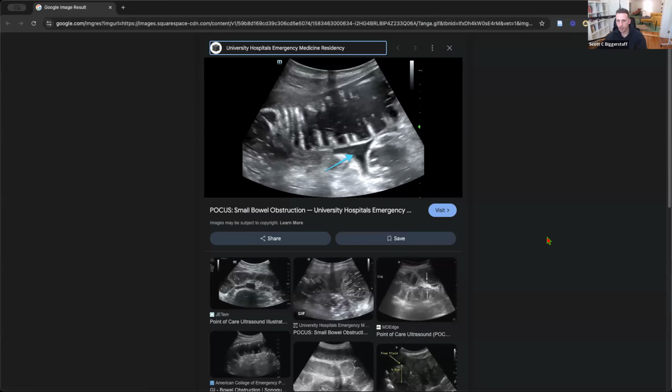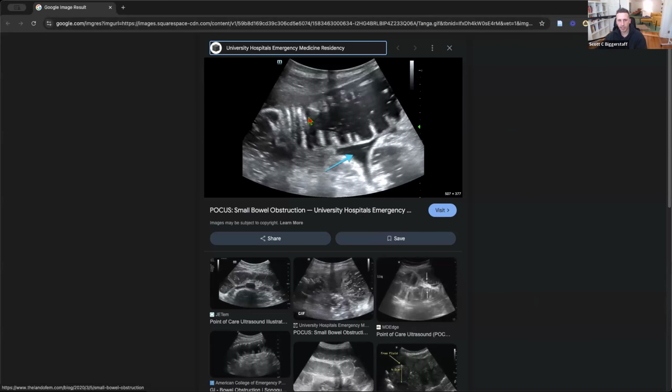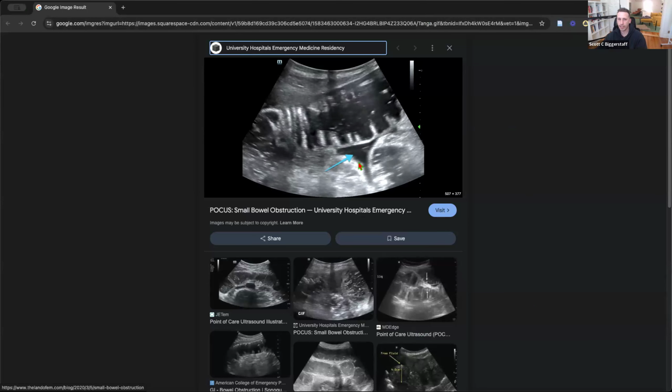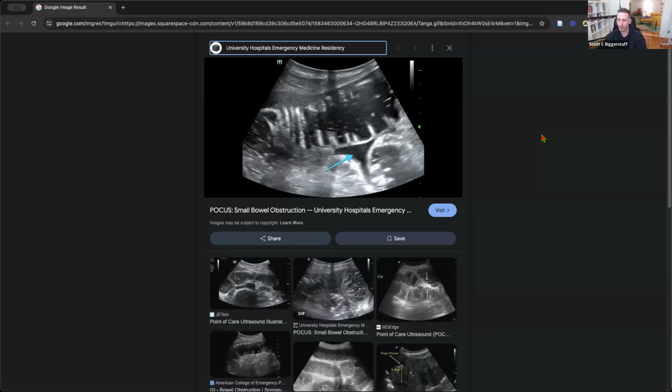Here's the image that Andrea shared in the chat. So you've got the plicae, like she was saying, these kind of fenestrations in the bowel, and then this is fluid that's collected in the abdomen between intestine. So you have that thong or bikini sign. Probably it's due for a more politically correct name at this point, but I'm not sure what that would be in the moment. Now that's all I can see. So I'll stop sharing that.